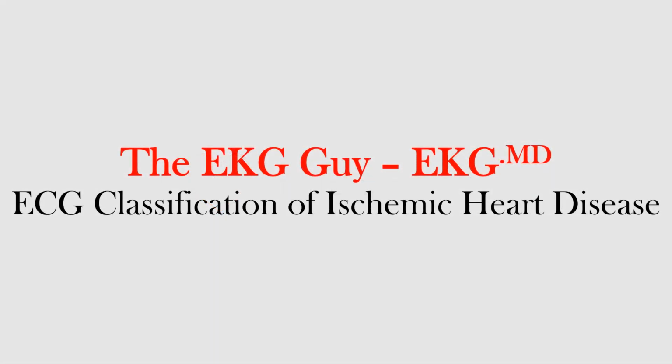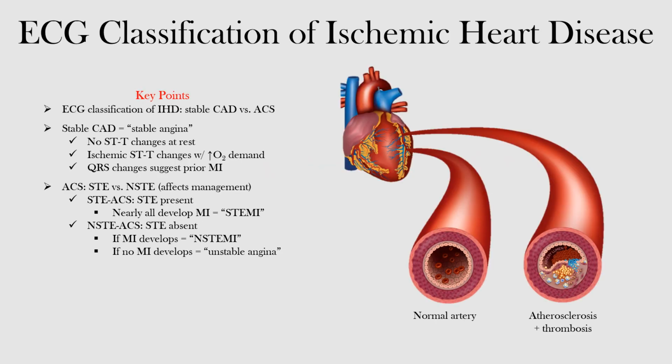In this lecture, we will discuss the ECG classification of ischemic heart disease. The EKG can be used to classify different stages of ischemic heart disease. Characteristic STT changes, QRS changes, and other features can help guide management of acute coronary syndrome. What we want to look at here is how we can classify ischemic heart disease with these changes.